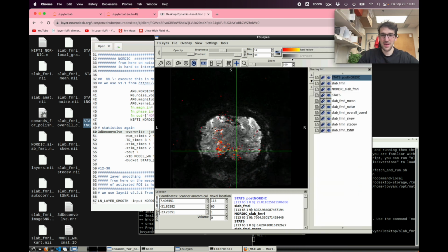Now you can see a lot happened there. A lot of these false positives are gone. It cleaned up a lot in the brain too. However, some of it is not cleaned, which seems to be then the true activity. This weird thing is still there to some degree. We have a lot of nice activity in the sulcus. This is more packed together. So we removed a lot of thermal noise components now.